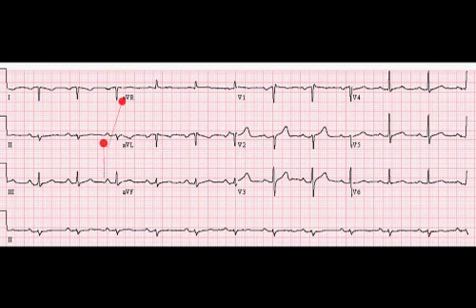But there is another circumstance, and that is with somebody with situs inversus, with their heart on the wrong side. But that isn't it in this case, because the chest leads are the way a normal sequence occurs. So this is categorically arm lead reversal, and therefore it is not an acceptable electrocardiogram. Good.